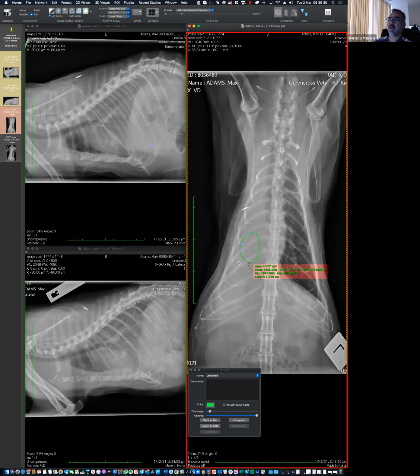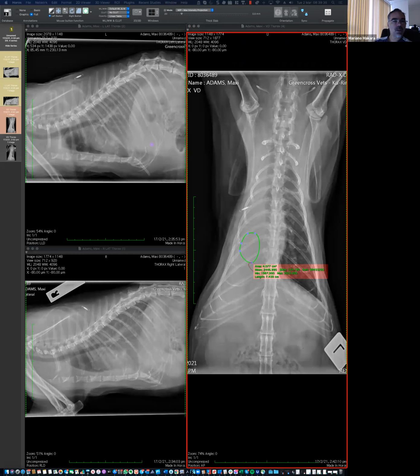I hope I'm not going too far and being too confident, and that's why I wanted to remind you that we got a case like this. Now I'm lost again. Okay, here. I'm happy to show you the CT on that case because it's a very similar case. I think it was case 18, if I'm not wrong. No, it's not 18 here. If you want to review that case, that was exactly a bronchogenic carcinoma, and we went through a CT, and I showed you the radiographs.